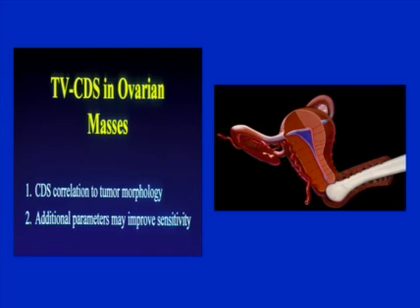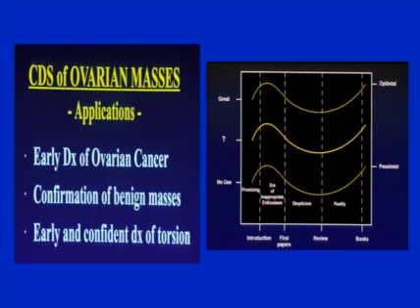Morphology meaning assessment of tumor wall, tumor papillary excrescence. Those are morphologic features.